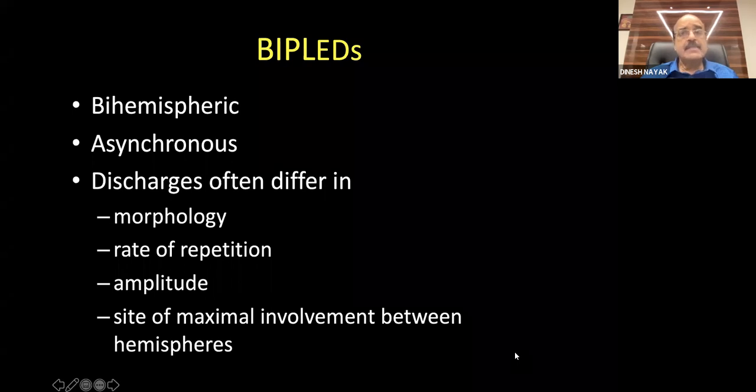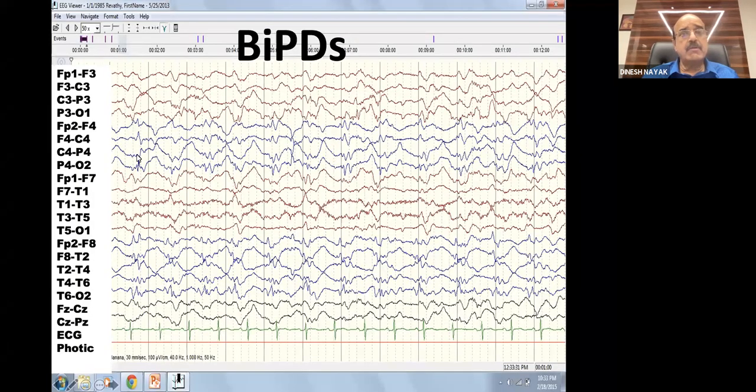As an example of BiPLEDS, you can see that in the right hemisphere, there are PLEDS going on.